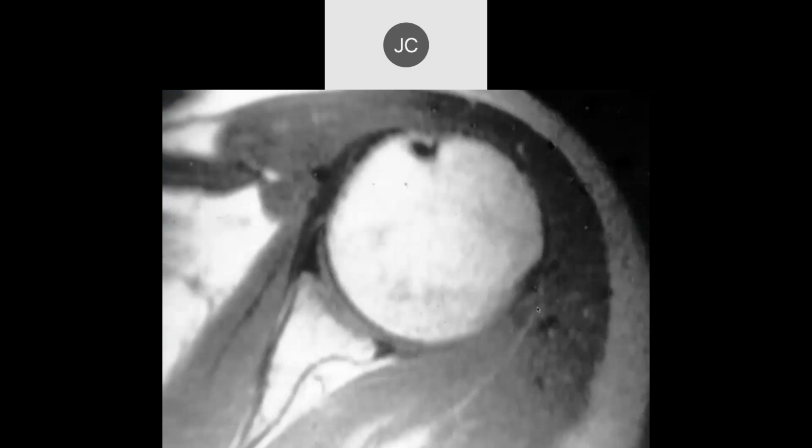So on an MR scan, this is what it looks like, an old MR scan. Here we can see the subscapularis muscle. There's the tendon attaching to the lesser tuberosity. As you all know, on the other side of the biceps is the greater tuberosity. The middle glenohumeral ligament is right in through here. It's a thickening of that anterior capsule in this location. Then there's the anterior labrum, posterior labrum, and the posterior capsule back here.